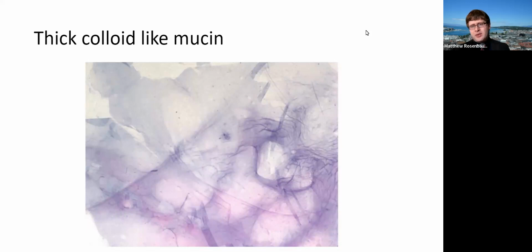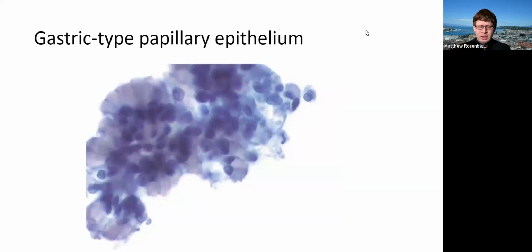So this is not the kind of mucin you see just from gastrointestinal contamination, which is always going to be your main differential diagnosis. Like I said, if you see it grossly, either you see it or the endoscopist sees it, that's also something you should mention in your report as well. So the gastric type ones are kind of going to be the trickiest one, because oftentimes you're going to be either going through or going around the stomach. In this case, if you see sort of papillary fragments, or sort of these three-dimensional fragments of mucinous cells, that makes you think that you're really getting true cyst sampling.